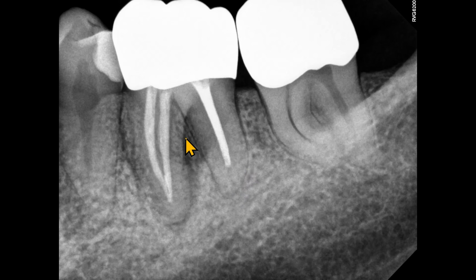Around the mesial root, the lamina dura is not clearly visible. We have an irregular radiolucency almost from the area of the bifurcation to the area of the apex. A similar but less pronounced finding is also seen on the mesial aspect. The trabecular bone around the roots of the first molar has slightly increased density. Some of these findings are indirect radiographic features of vertical root fracture.